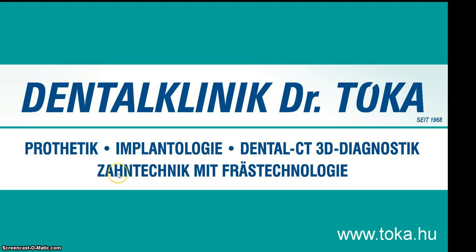Dear patient, thank you for going to Cavendish Imaging. We have received the CT data for the planning of your situation. We created a three-dimensional plan of implant placement, and I would like to show you in this video what exactly I see and what the solution to the problem is.